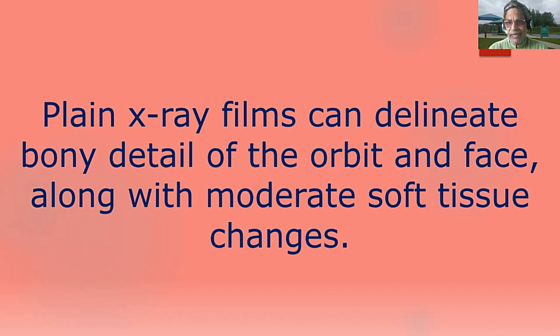That is what I'm telling in one case. You take an X-ray lateral view of the skull. This is a question common in examinations. When you see the lateral view of the skull, you are supposed to see the sella area, the sella turcica. Now they will ask you, not only sella turcica, from the neck you can see a soft tissue going upwards. That means what? It can give us a clue regarding nasopharyngeal tumors also. That's the importance of the lateral view of the skull. The soft tissue changes can give us a clue regarding nasopharyngeal tumors.